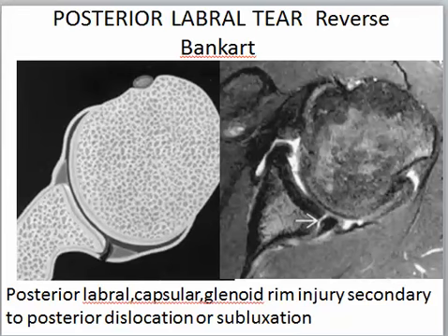Posterior labral tear, here it is. This is posterior labral tear, secondary to posterior dislocation, or what we call reverse Bankart.